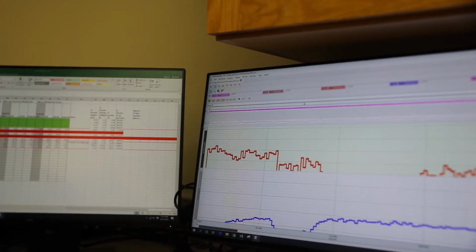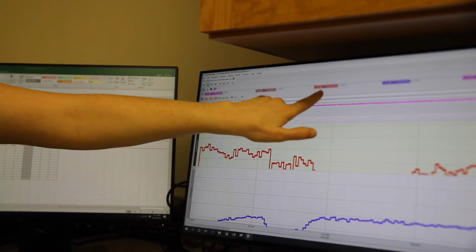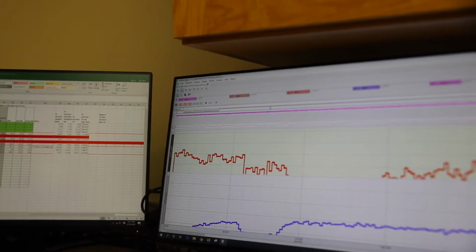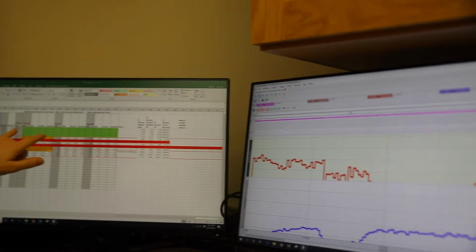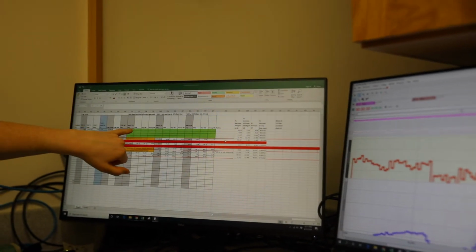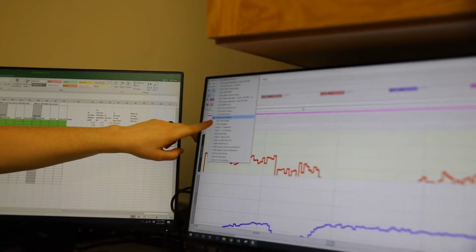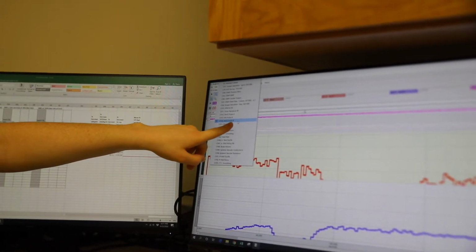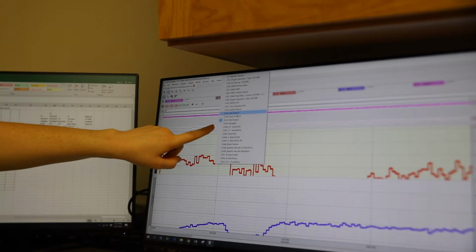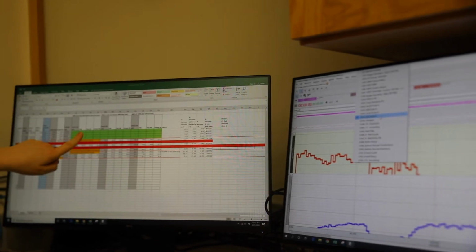So we're going to scroll to the beginning, and we want to first double check that these numbers here, the 14, 15, 51, and 52, are the correct measurements that we want to use, which should correlate with what we have labeled in the Excel sheet. So the SMO2, or the percent saturation, should be this first label here, which it is. Should be SMO2 for probe B, because we always use probe B with the NIRS.